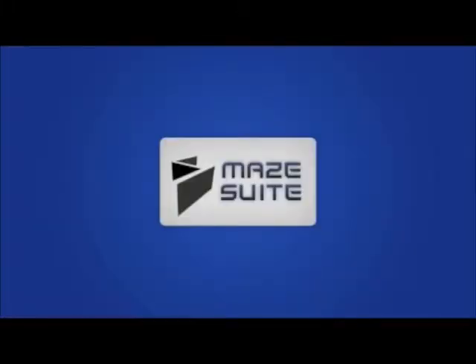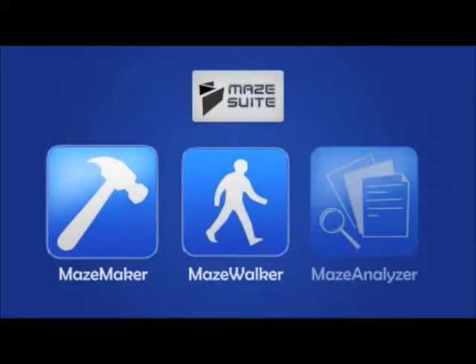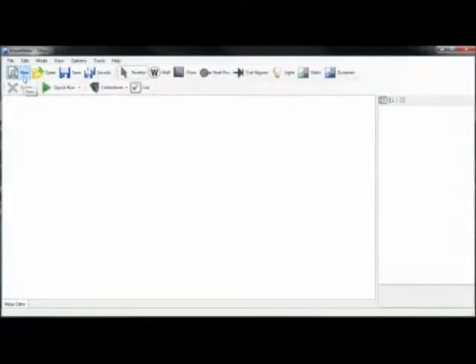Maze Suite consists of 3 components, each targeted towards a specific stage of the experiment: design, experimentation, and analysis. Maze Maker allows the user to easily design a 3D environment for each stage of the experimental protocol. Simple environments can be created in moments.